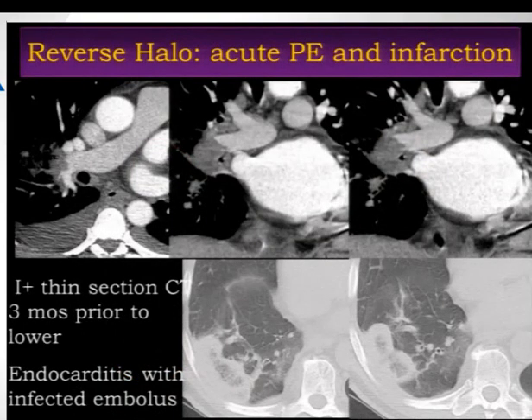There's another patient who was referred to us also from an outside institution who came with shortness of breath and was noted to have these abnormalities and this filling defect here in the pulmonary artery. The patient was bounced from hospital to hospital and came to our hospital, and multiple biopsies were performed of this particular lesion, and nothing came back but just inflammatory material and some debris and some macrophages.